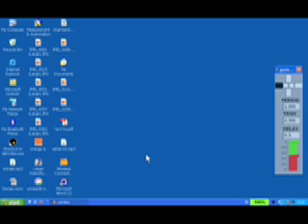You'll notice that between the directional rectangular bars there are also 2 circles. These denote the left and right mouse click buttons, and these can also be selected by a sniff. You'll notice at the bottom of the interface a red bar indicating sniff or nasal pressure threshold, and a green indicator that demonstrates the current nasal state or nasal pressure state. The user just views the rotating actuator and selects the preferred direction by a sniff.